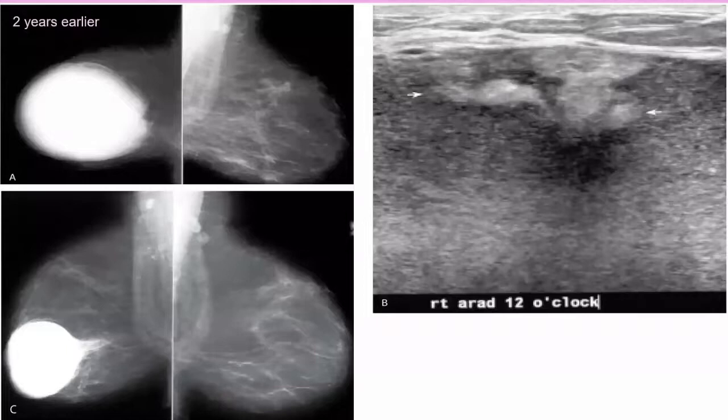It is complex until you make sure what the nature of this hyperechogenic material is. It might obscure something underlying, or itself it might be hyperechoic soft tissue. You have no Dopplers, so it will be an apparently complex lesion of two different components, hyperechogenic and cystic, and the lesion was big.